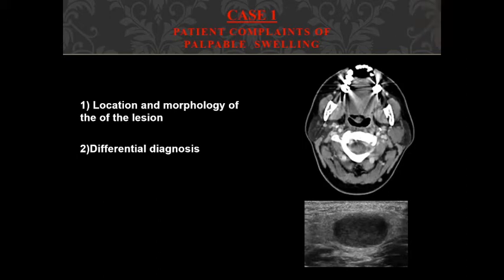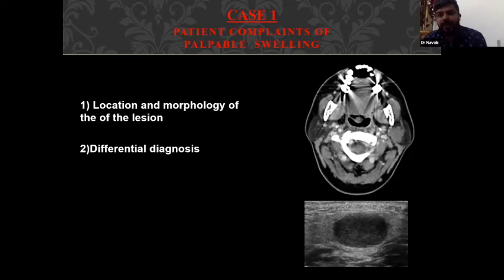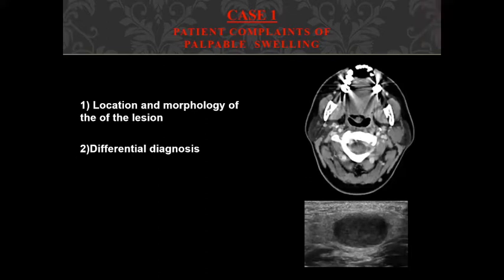I will give you one clue. Patient presented with palpable cheek swelling on the left side. Sir, near the parotid gland. Deep to the parotid gland, I see a soft tissue density area. So the location is in the left parotid space, right? Which has a well-defined pattern. Yes, sir. Deep lobe of parotid. And it has a well-defined fat plane with the adjacent mandible, the carotid vessels, and the prevertebral muscles.